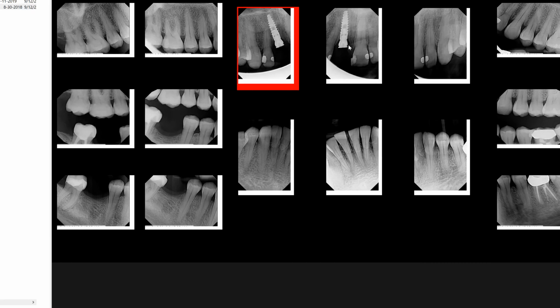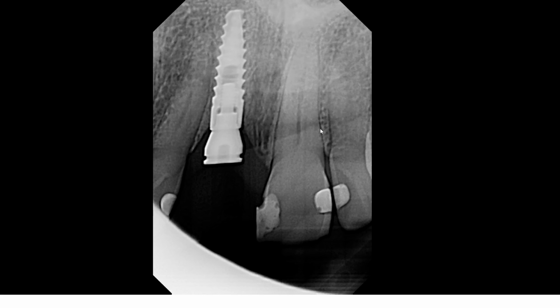Now, having said that, I want you to see a different projection of this area. Again, we have implant number 8. Here's tooth number 9. And from this particular view, the distance between tooth number 7 and implant 8 looks even closer, maybe a millimeter, but perhaps not even a millimeter at this point. And that is due to the slob rule or slob technique.